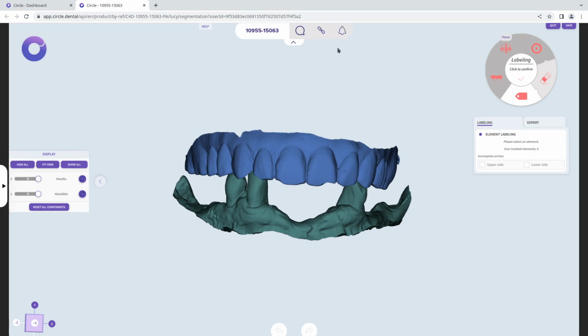Here you have the information about the patient, so that's the patient ID. These are the instructions given by the doctor, the dentist. So here it's me, the date, and the training. So there is no instruction, but there could be more instructions. Here you can give the dentist the link and see the software working at the same time that you do the job.